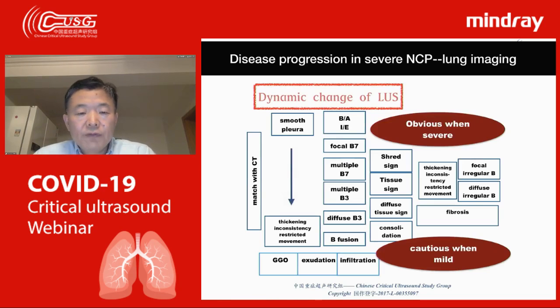And if from the CT scan it is some normal condition, but the diffusion, how to say that, I think this is still a lung ultrasound image.